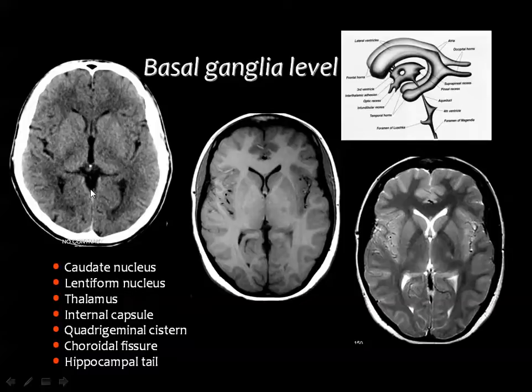This area is above the cerebellum, so it is known as the superior cerebellar cistern. Then the anterior corner is just a CSF recess passing above the third ventricle. It is known as the velum interpositum. I will talk about this velum interpositum later on.